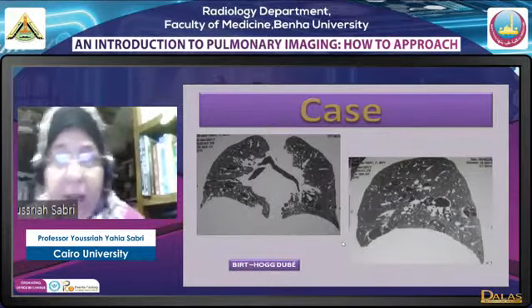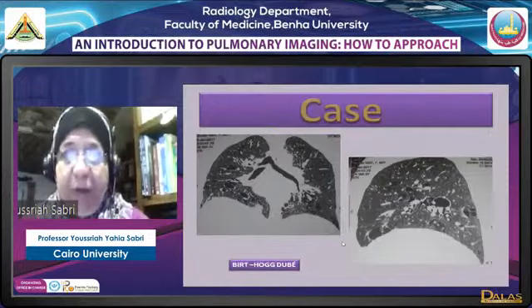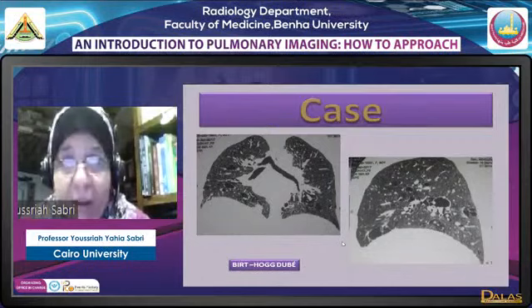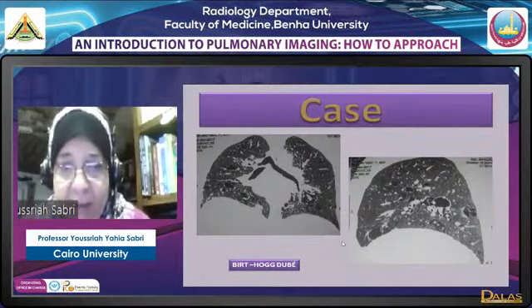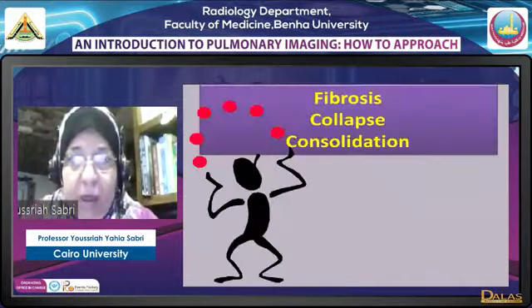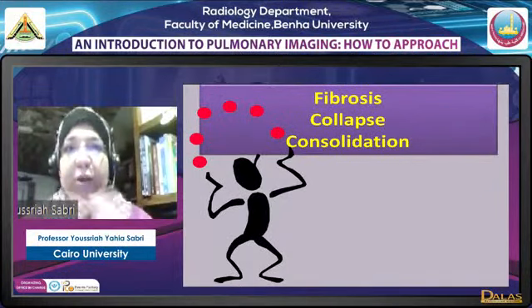Why I'm presenting it here is to tell you, okay, there are common lesions that you will meet a lot, but sometimes you will meet something out of the way. Then you start looking it up, and this is one of the things that are out of the way, the Birt-Hogg-Dubé syndrome. To shift now, we have finished with well-defined lesions.